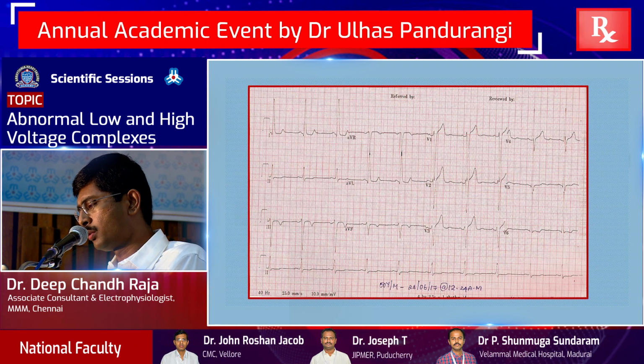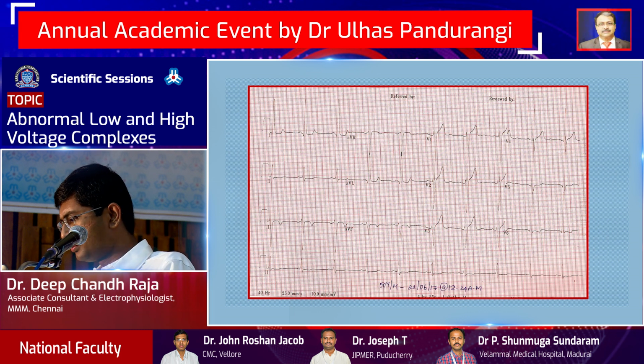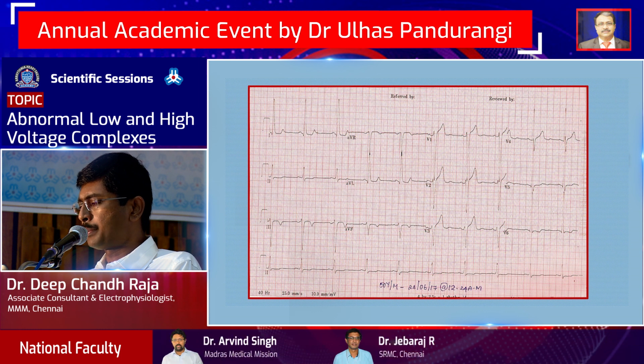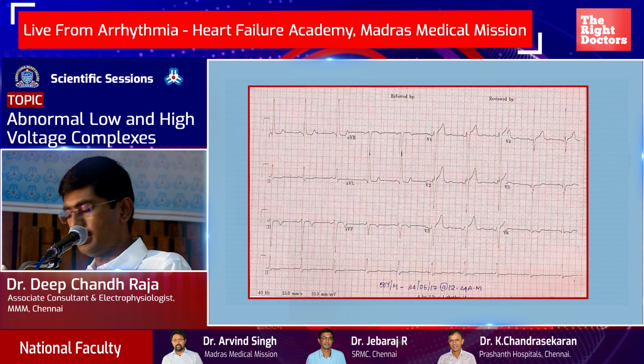This patient was one of those patients of obstructive hypertrophic cardiomyopathy. The R waves you can appreciate better on lead V4, and the same thing in V5 and V6, the tall R waves and ST-T changes.